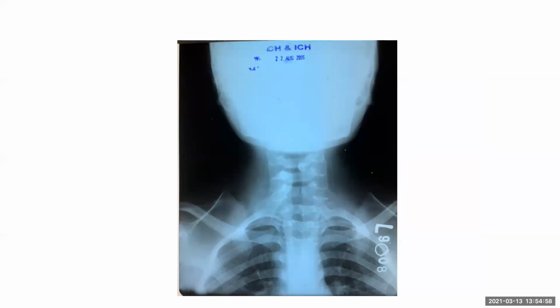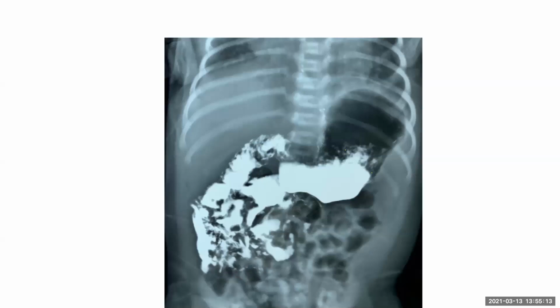Okay, this one is bilaterally small, highly placed scapulae, Sprengel's, and omovertebral bones articulating with them. So these have associations, right? Yes, madam.